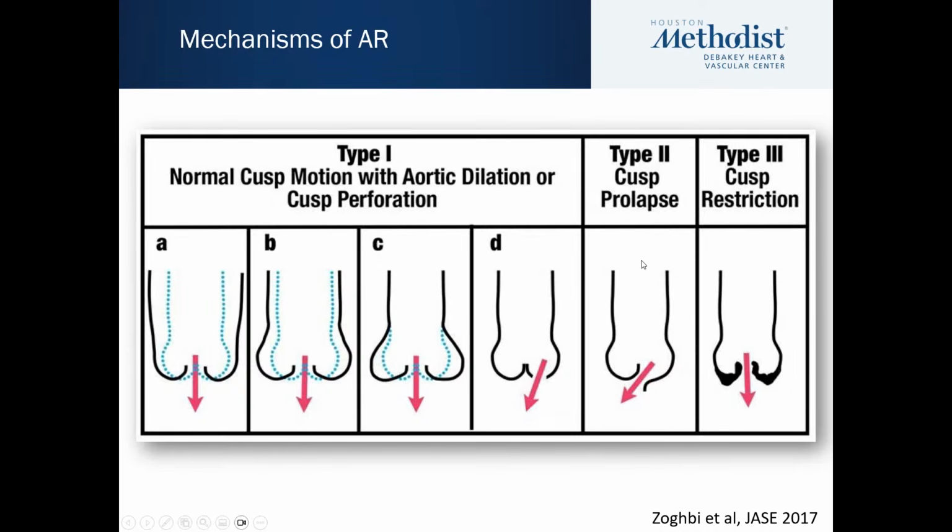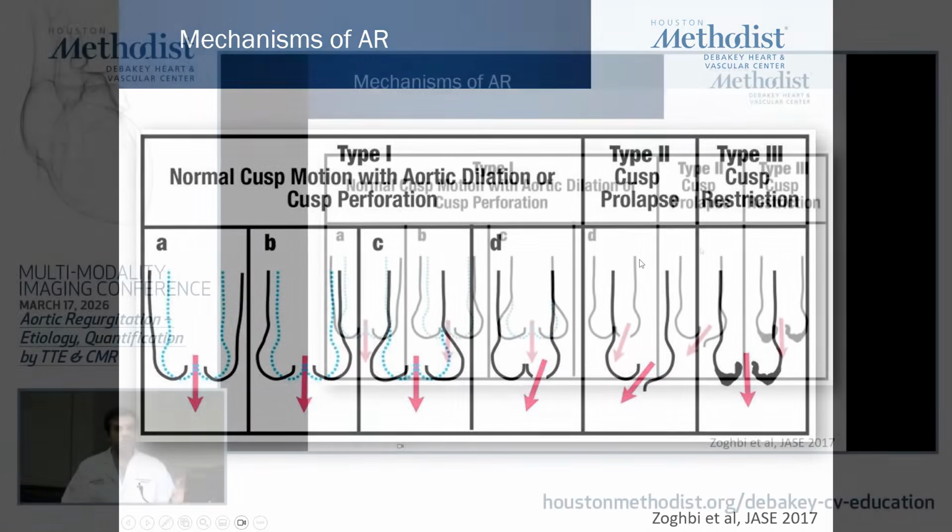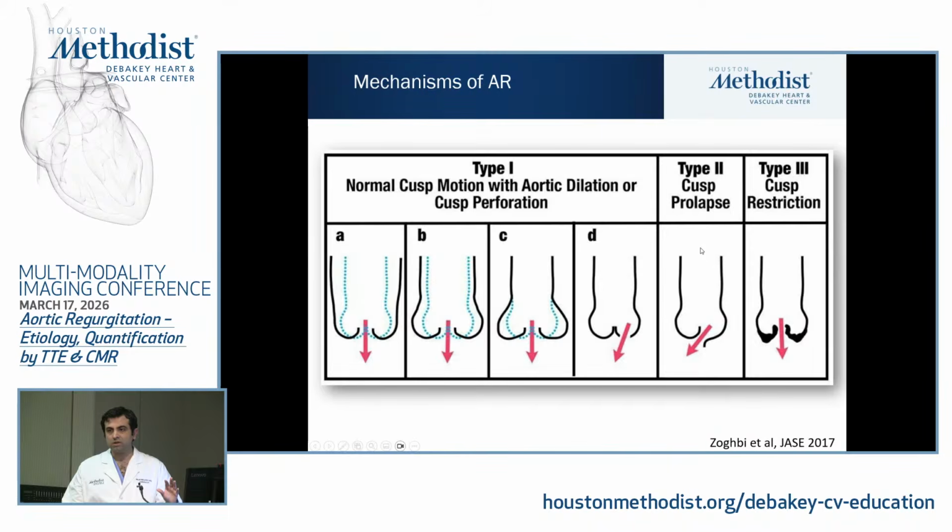Type 2 is one of the patients that you don't really want to miss. This is important for both echo reporting, but more important also for deciding on management. A lot of these patients can get AV repair, and you don't want to say, oh, this is just severe AR without more description of what's going on with the leaflets. As you may suspect, the more common patient population in this category is people with bicuspid valves, unicuspid valves.